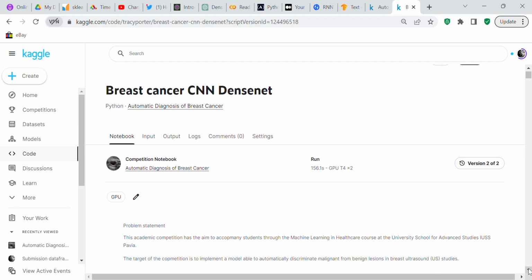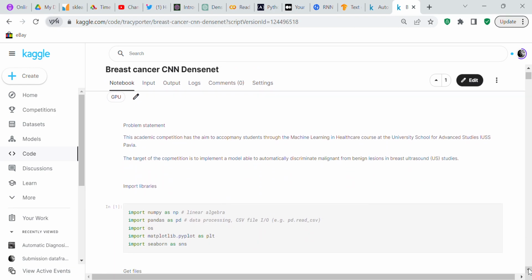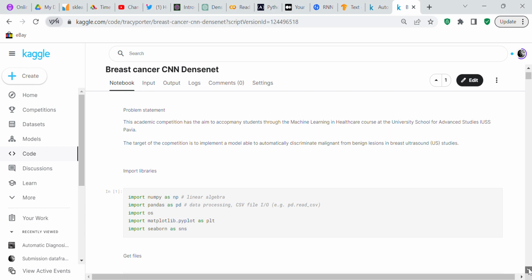So we're using the Automatic Diagnosis of Breast Cancer Community Competition. And this is my work. This is what I have done. So this is the problem statement. This academic competition has the aim to accompany students through the Machine Learning and Healthcare course in the University School for Advanced Studies, Pavia. And I looked it up, and Pavia is in Italy. The target of the competition is to implement a model able to automatically discriminate malignant from benign lesions in breast ultrasound (U.S.) studies. So that's what it is.